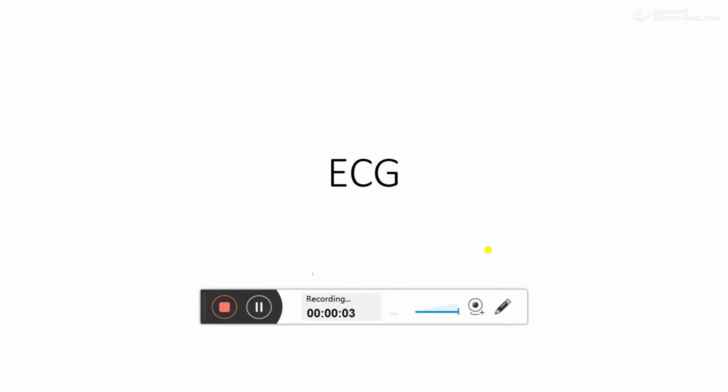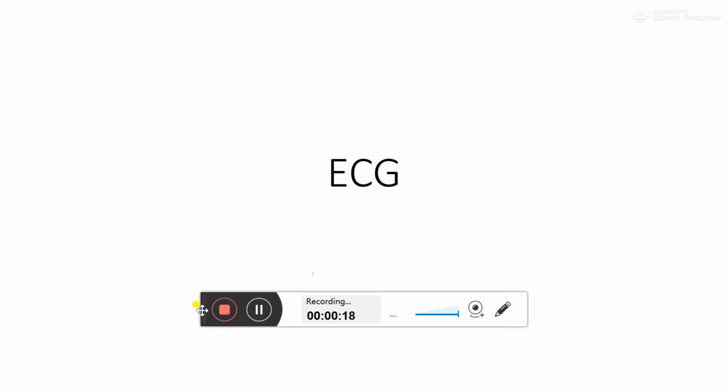Hello everyone. Now I will discuss one of the most important things: how to interpret an ECG. I will show it step by step. Okay, let's start. We know that an ECG is a graphical representation of our heartbeat.